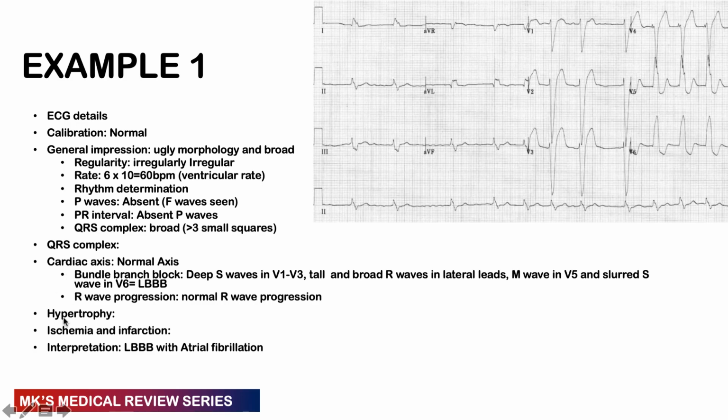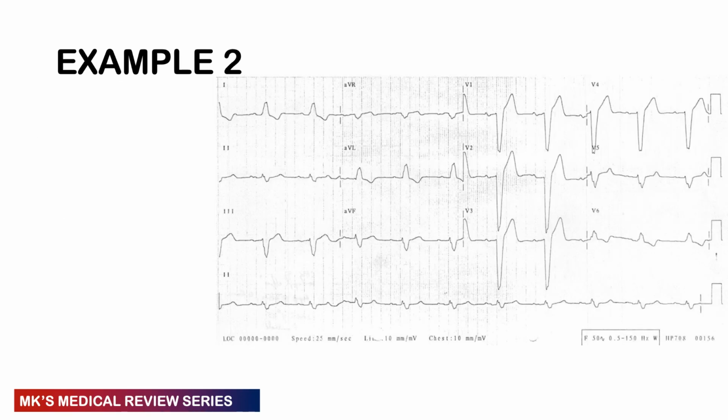We haven't yet commented on hypertrophy, if there's presence of any hypertrophy or any presence of any ischemia or infarction. We haven't yet done that, so I will not comment on that in this particular video. We'll do that a bit more when we look at the end of these particular videos.